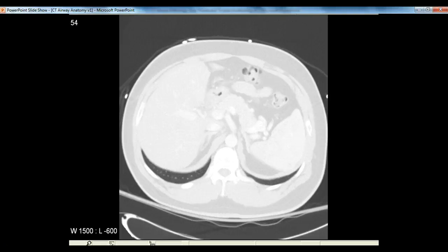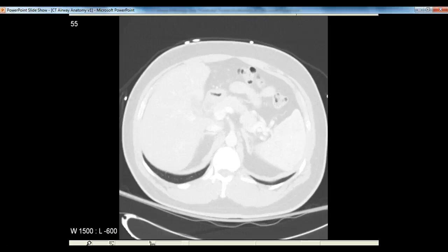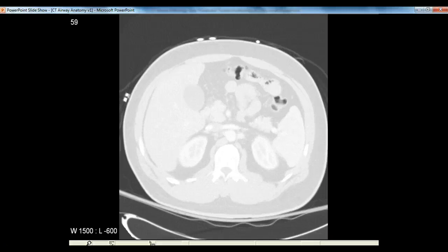we've still got lung. We were seeing almost the entire spleen. We're seeing almost the entire liver. We've got all sorts of bowel. We've got the pancreas, that thing that almost looks like a caterpillar that goes up in the middle and comes down. And we're actually starting to see the top of the kidneys here. And we've still got a little bit of lung there posteriorly on the right. And so it's only here at the very inferior most posterior ribs that we're finally no longer filling that space with lung. We're now entirely into the retroperitoneum and the abdominal cavity.